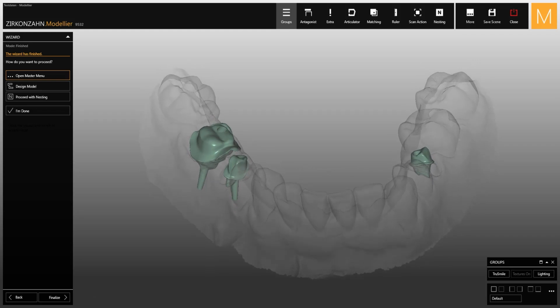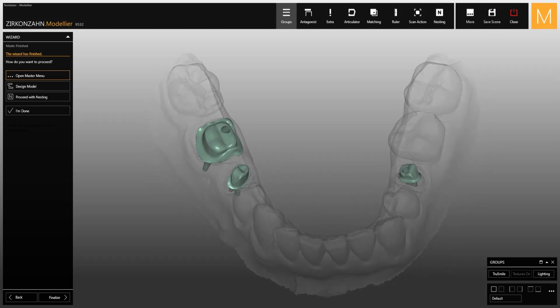Watch the upcoming videos and discover all the new features of the Zirkonzahn Modelier software.